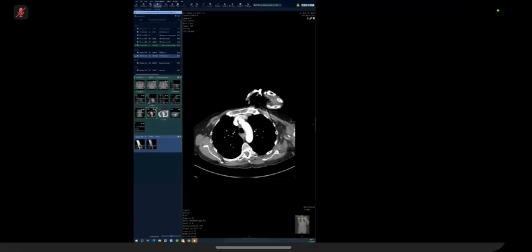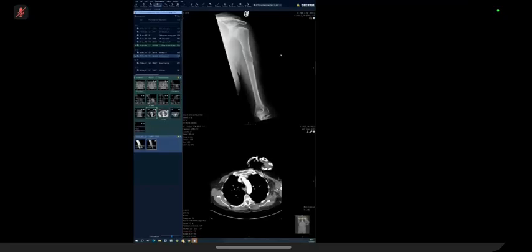When you see a fracture in a VIVA, nobody's going to show you a plain fracture unless there was something special about the fracture management or the location of the fracture. It's a typical mid bone fracture. It's not going to be a simple fracture. If you pick the fracture straight away, you immediately need to start thinking about pathological fracture. They're not showing you a fracture, they're showing you something about the fracture they want you to talk about.